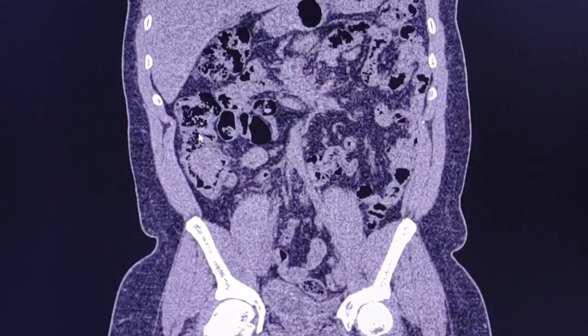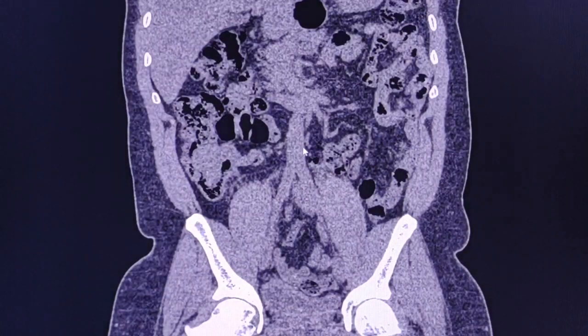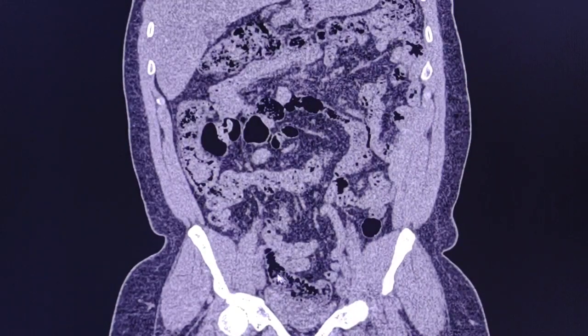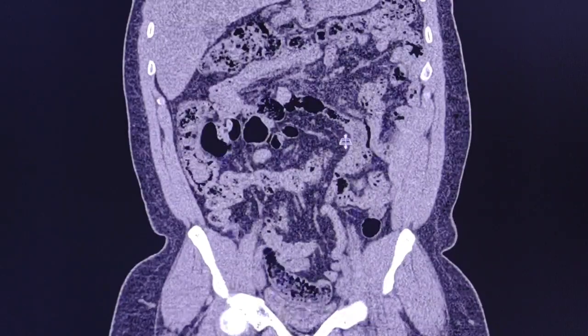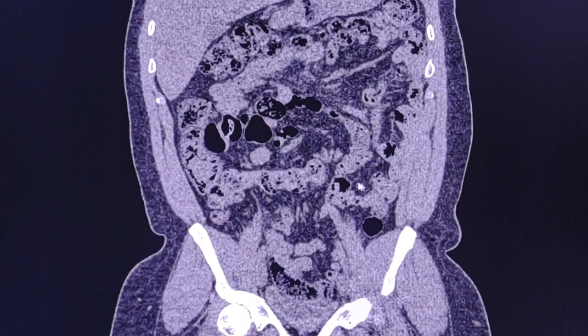So in the periphery is the large bowel, the ascending colon, the descending colon, and all the rest is multiple small bowel loops which show significant fecalization. This finding is the most likely explanation of the patient's symptoms. In recent years, many similar cases have been assigned to me for reading, and my impression is that this condition is quite common. That's why I present it to you.